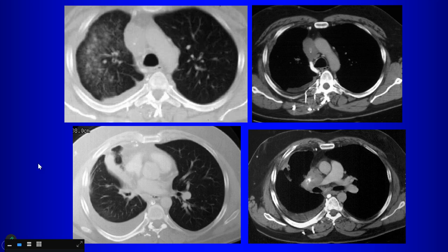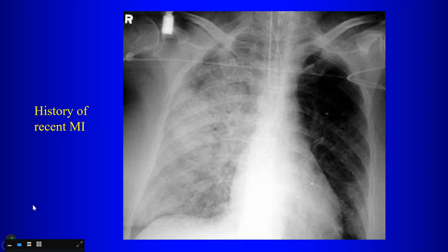The process can also obstruct the pulmonary veins, resulting in pulmonary edema in the right upper lobe. Tumors can do that, but also benign disease like fibrosing mediastinitis, as in this case it was fibrosing mediastinitis, causing obstruction of the pulmonary vein and SVC, resulting in pulmonary edema.